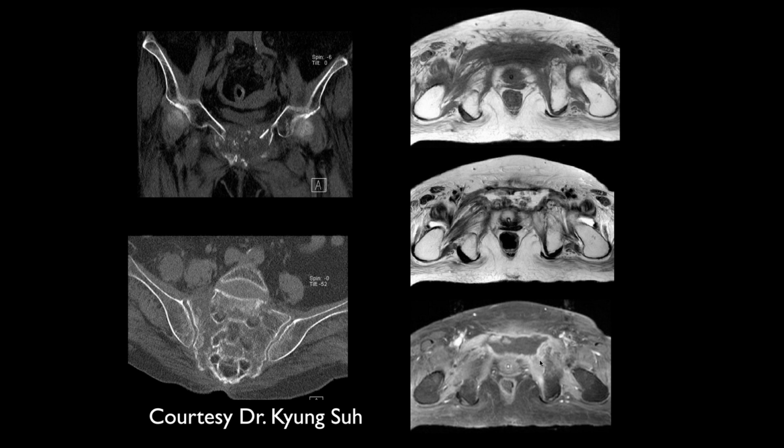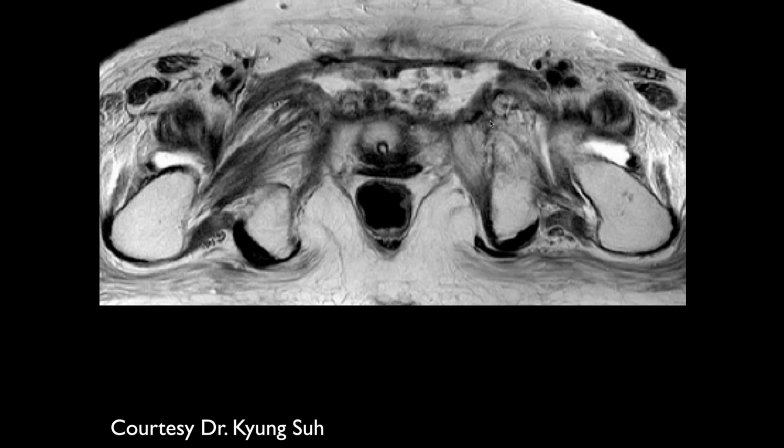Is this an enhanced T1, like that almost fat-set T1? That almost looks like a rim-enhancing fluid collection. Okay. So I don't know, this could be infection of some sort. Here's that. And it looks like it might have some debris in it, or just osteolysis. Yeah. Okay.